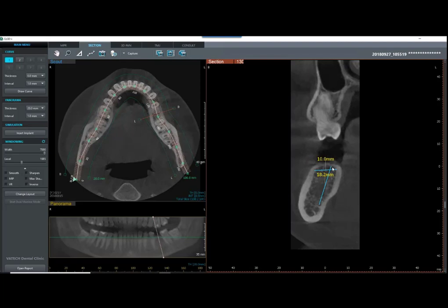and the tool stays on. So if you want to turn the tool off, you have to do a right click, and the tool will go off. A common question is that the measuring numbers are kind of in the way. And you can always grab them and pull them out of the way to the side of the image.